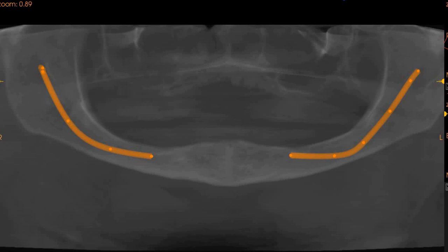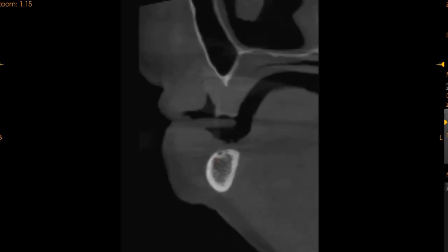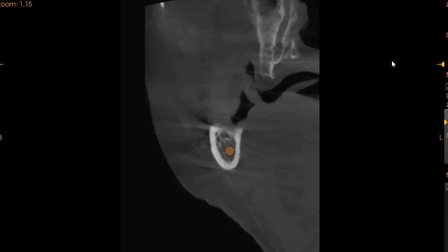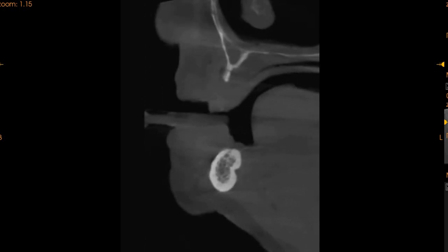Now moving to the transaxial view, the transaxial view is going to show us the tooth from a proximal aspect. I will take you through the maxilla from the top right. This is the top right region of the maxilla. And as we move towards the midline, this is the molar region. As we move towards the premolar region, you can see how thin the ridge is. It's absolutely atrophied and thin, which does not even support any kind of bone structure.